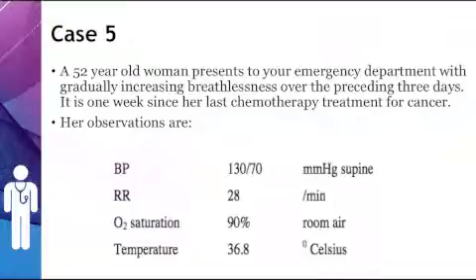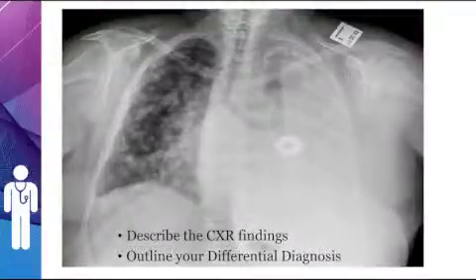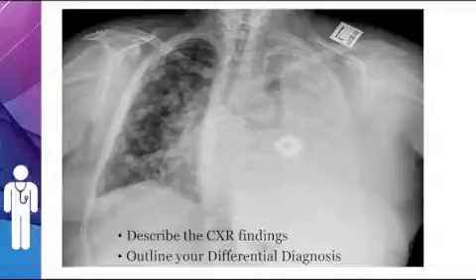Here's a 52-year-old lady who comes into the ED with breathlessness after some treatment for cancer. Have a look at the X-ray and let us know what you think. So you can describe the X-ray and outline the differential diagnosis.